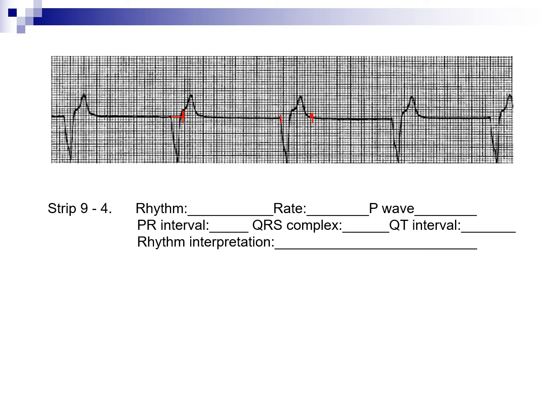So this interpretation is, again, when you're looking at the QRSs, the first thing you should be noticing is, what is the QRS?